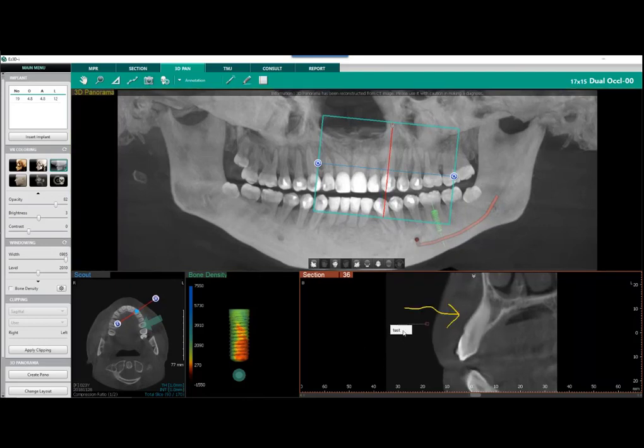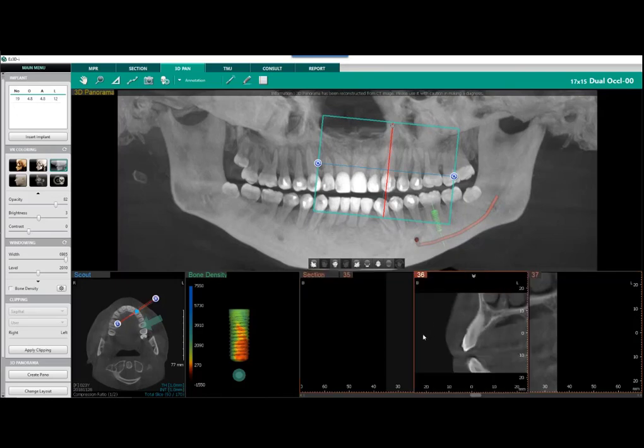Thanks, Paul. The nice thing about this is we can also hide or delete that. So let's go ahead and hide this. I'm going to come here, right click and hide that also. And let's go ahead and hide that there. So that's some of our drop down tools from measurement. We've covered our capture and we've looked at our annotation on that. So I think we're good to navigate from this section.